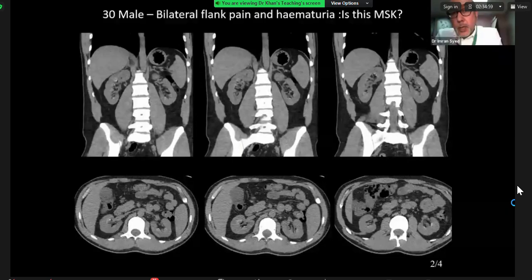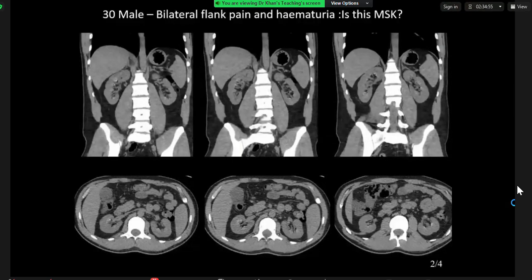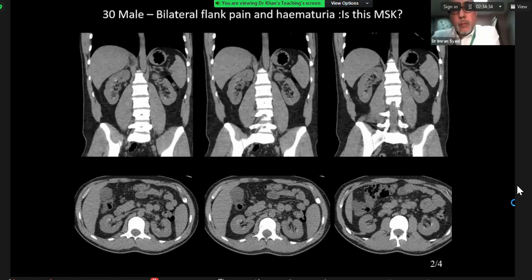And why do you say that? It appears to be predominantly centered in the corticomedullary junction area, and it doesn't appear to be very diffuse, slightly faint in appearance as well. So I think it's less likely to represent medullary calcification.